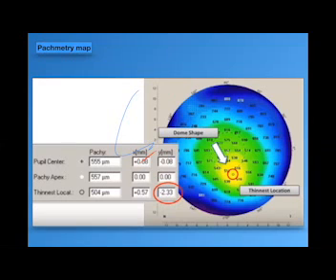So study here the thickness. The thinnest location in the cornea should be more than 490 to think in refractive surgery.